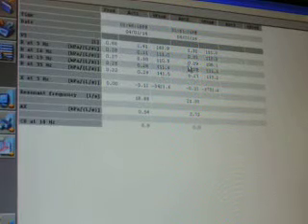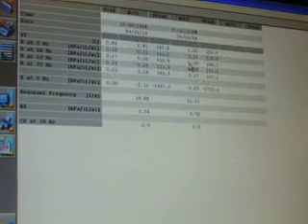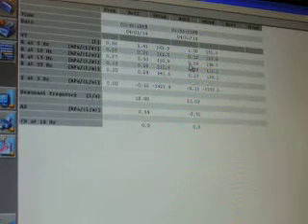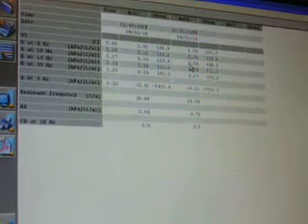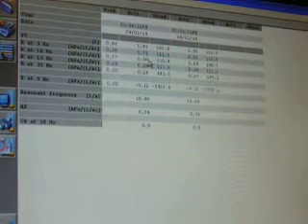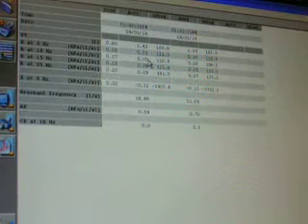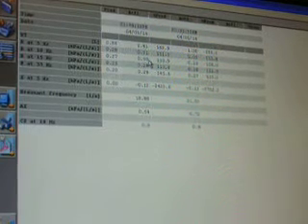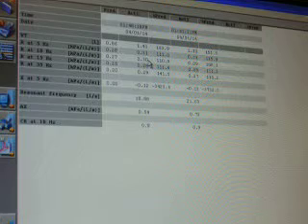If we had a third one in this range, then we would have met repeatability, acceptability, and our session would have been completed. So make sure that when you're looking at repeatability, it's not like spirometry where you looked at the largest and the second largest had to be within a certain range.